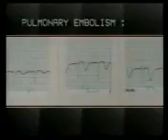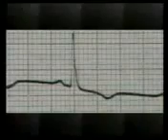The fifth cause for T wave inversions with acute chest pain is pulmonary embolism. Inverted T waves with raised ST segment as seen in myocardial infarct are seen in leads V1 to V3. This picture with inverted T waves in 3 and aVF suggests acute pulmonary embolism, but these changes are not diagnostic and have to be supported by clinical and other evidence.